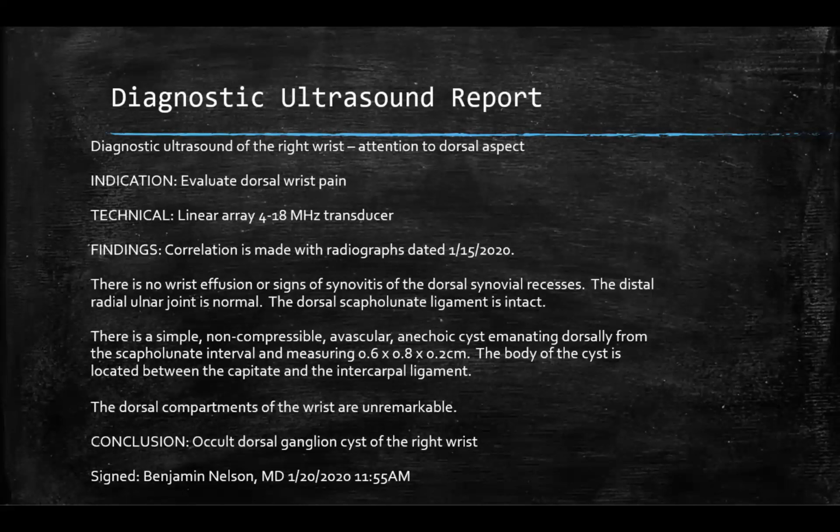When you're not sure, you can recommend other imaging, you can recommend follow-up imaging, and you should get comfortable with providing somewhat of a differential diagnosis based on the common features. So that's definitely a next level step with a lot of the ultrasound, but it's something to get comfortable with, so that you're not getting too intimidated by some of these masses.